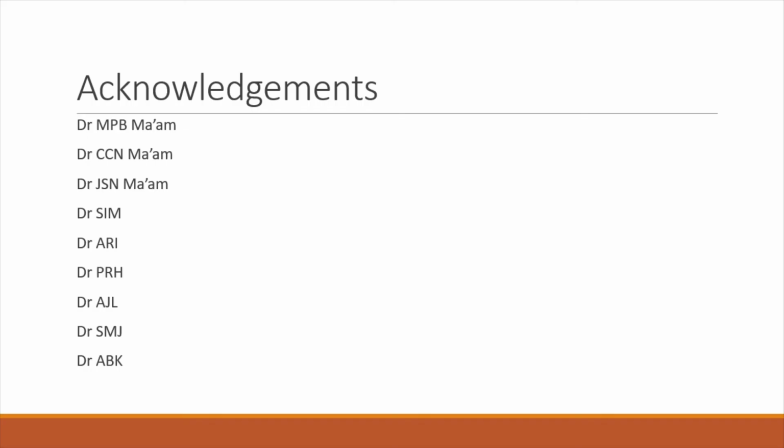Thank you. Any inputs? So for you to characterize any lesion on ultrasound, make sure the ultrasound beam is passing exactly perpendicular to the lesion. Only then will you get the best features of that ultrasound. Some of these images are not exactly the ideal images where you would describe the lesion. So make sure that you have the ideal scan first. Whenever you are giving the images or storing them, make sure that you store the ideal images.